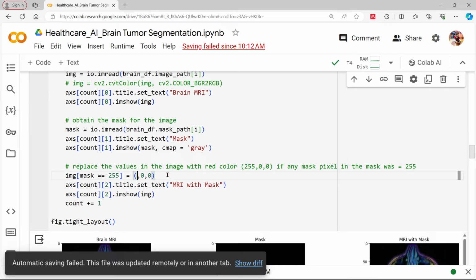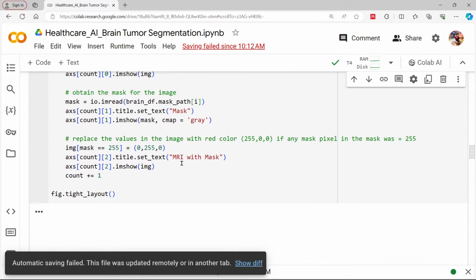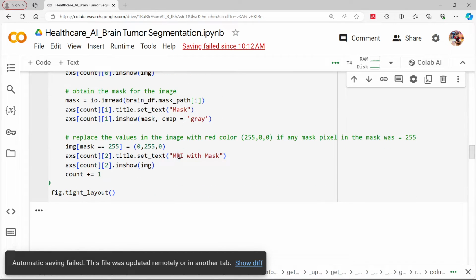Let's change this 255 to, let's say, I'm going to make it 255 in a different channel, right? So what is the meaning of 255 in RGB? This time I perceive this will be green, right? So you can change colors as well according to your sense. You can catch the sense of it. What is the value of this number? What is the meaning of these numbers? How is the RGB concept correlated with this red color concept, right?